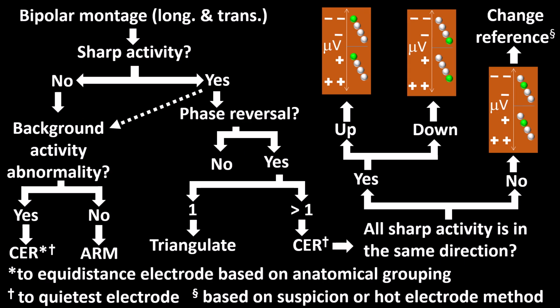This is certainly a very busy frame. Do not get frightened by its complexity. I will explain it little by little. First, I would like to tell you that there are many ways to skin a cat and just as many ways to read an EEG. This is how I do it most of the time. As I previously mentioned, I think the first read of an EEG should be done using bipolar recordings. Current monitors are large enough to allow simultaneous viewing of longitudinal and transverse derivations.